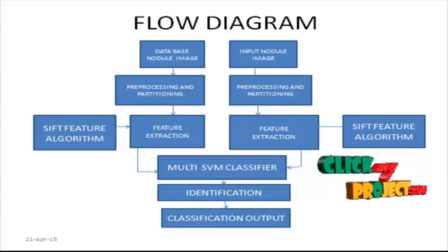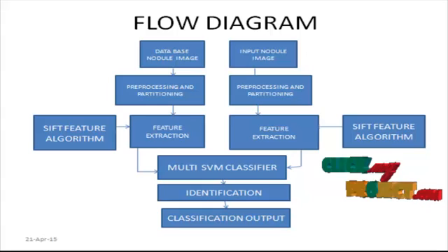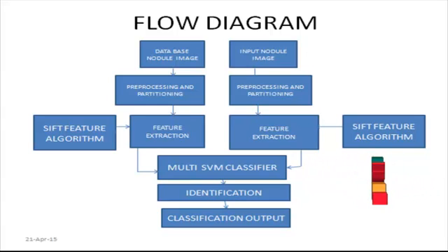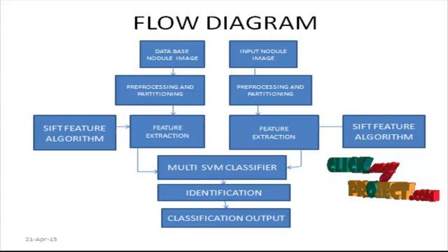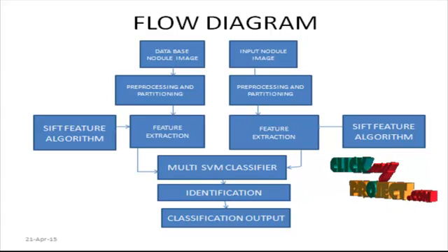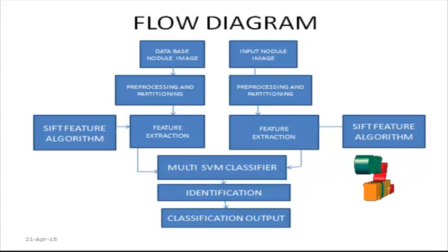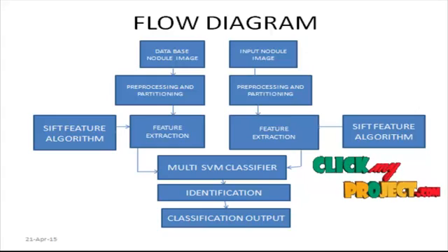These edge reduction results are used to identify the classification results. The classifier separates the nodule information, replaces the original information with gray level information, and identifies the final binary lung image result for the overall architecture process. This is our flow diagram for lung nodule classification.